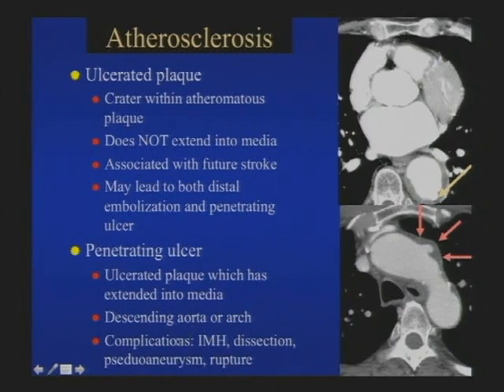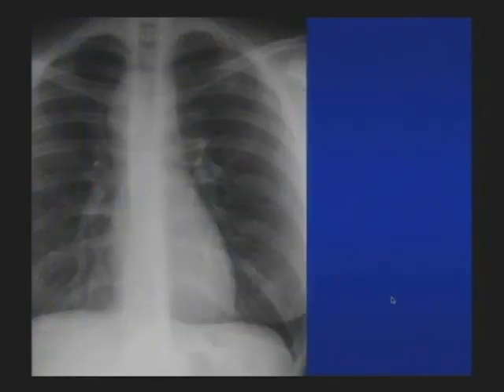And probably the most common of those that we see, like we see in this case, is a pseudoaneurysm, where you have a focal little saccular outpouching from the aorta because not all 3 layers of the wall are there, and it weakens. So those are the acute aortic syndromes.